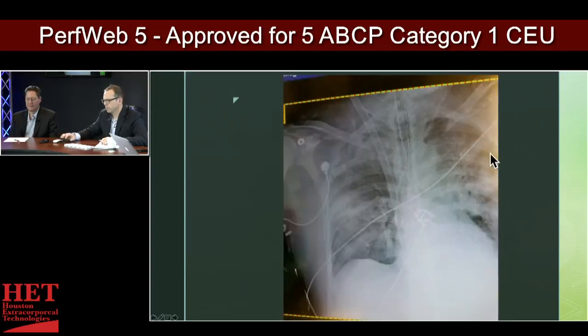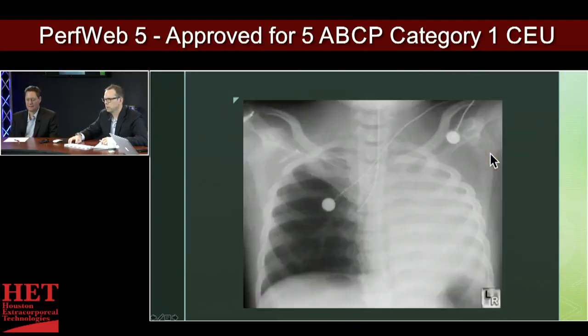So you mentioned that the bone structures look abnormal to you. You see the clavicles are rotated up because the arms are above the head. So it looks a little bit different from that perspective. You can see that there's an obvious difference between the left and the right lung fields. This lung field on the left side is nearly completely opacified. That's either lung tissue or it could be the heart as well over there. And then on the right side, you see not much of anything at all.